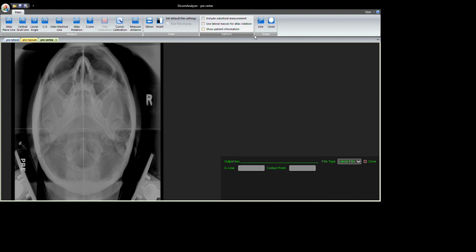And then this button allows you to turn on or off patient information. I had these preloaded because the patient information shows up by default. We did not want that to happen for a video that's going out on the internet, so I have it turned off. If you're ever presenting using this software, you're able to do that and still maintain your HIPAA compliance.